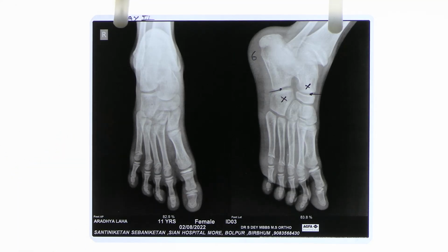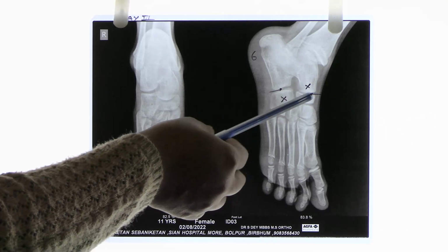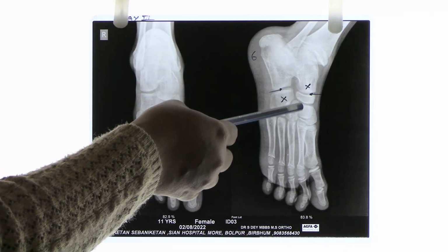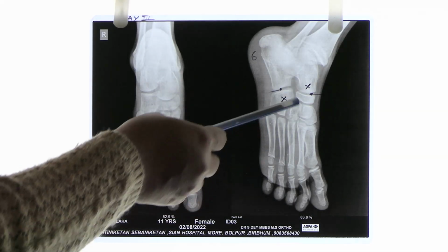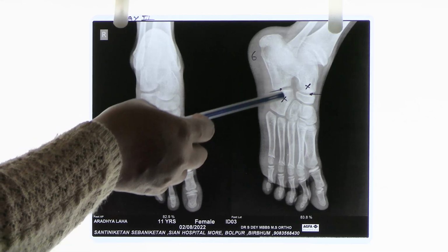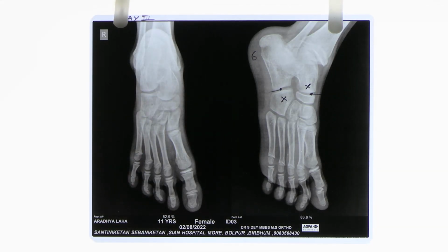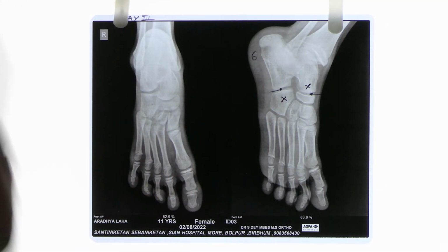Okay, here also these joints can be asked. Which joint is this? We have discussed in X-rays. Talonavicular, talus and navicular. Here is calcaneocuboid. So these two joints you may be asked, and together they form the mid-tarsal joints. Okay, you have read in lecture class.